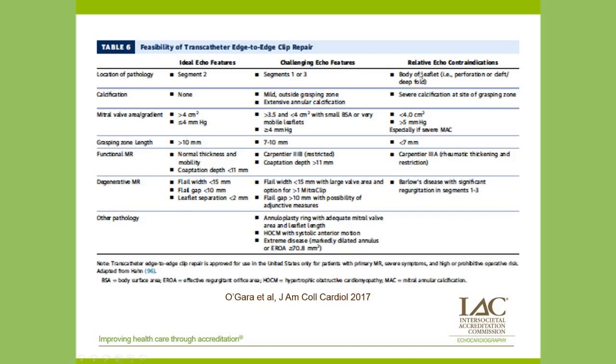And then when you get over here to contraindications, if the body of the leaflet is perforated or has a deep cleft, it may be hard to get a good result. If there's severe calcification at the grasping site, the clip won't stay on or won't even go on. And if you have an area less than 4 centimeters squared, you're going to risk mitral stenosis, especially if there's severe MAC.